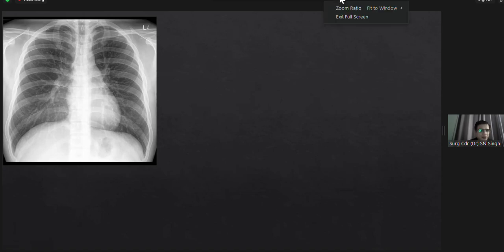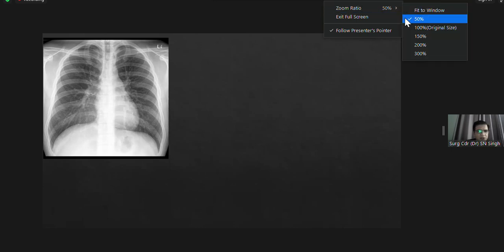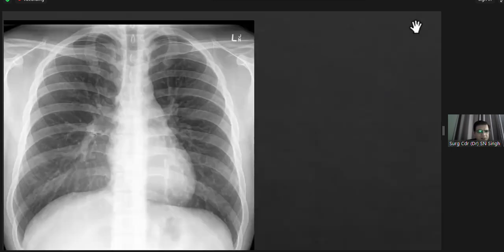While doing this, you are getting time to check for the pathology. So bilateral 12 ribs are normal, sir. Intercostal space is normal. The lung pathology appears clear. I'm looking at the cardiac silhouette. It's normal. Bilateral hemidiaphragm is normal, and the vertebra, I think, is normal. See, in 15 seconds, you have seen everything. I think, sir, it is a normal chest X-ray.